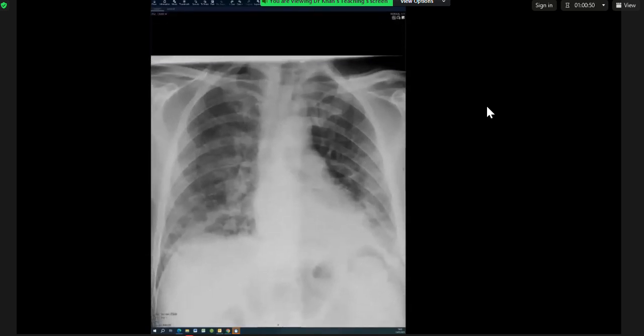I can see that the left lung shows a degree of opacity in the lower zone. On this window, I can't pick the left hemidiaphragm well. So in my routine practice, I will modify to see if there is a lesion in the lower zone silhouetting the left hemidiaphragm.